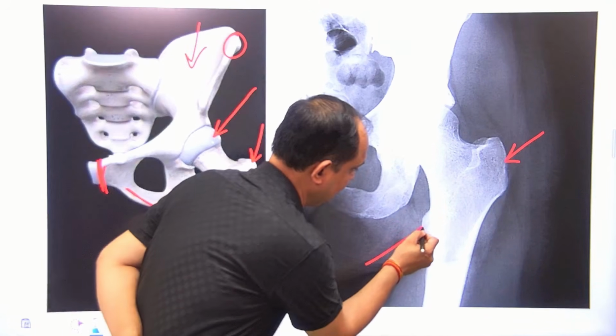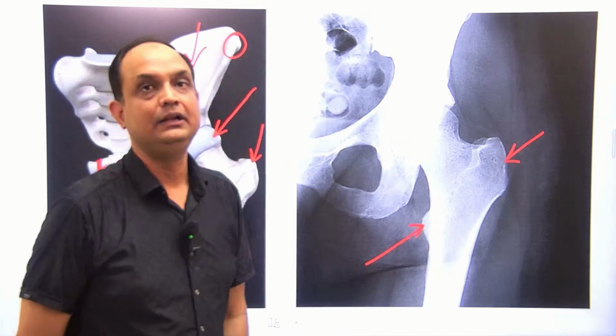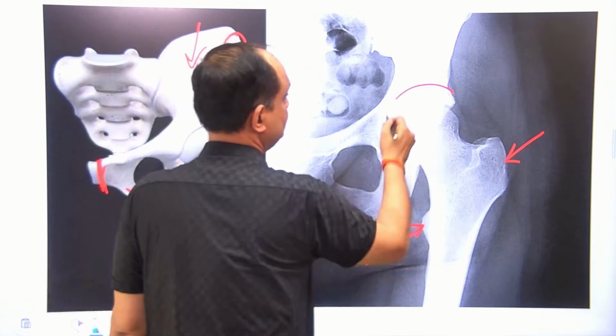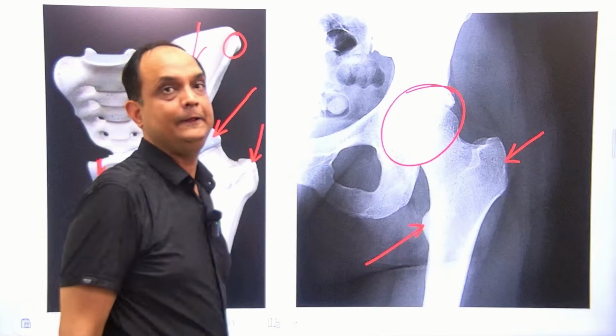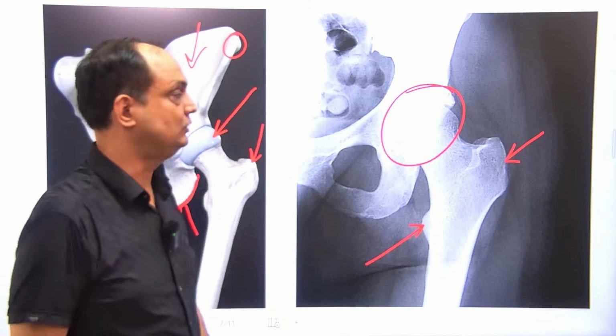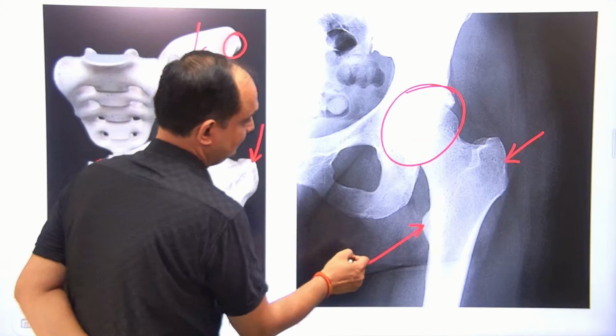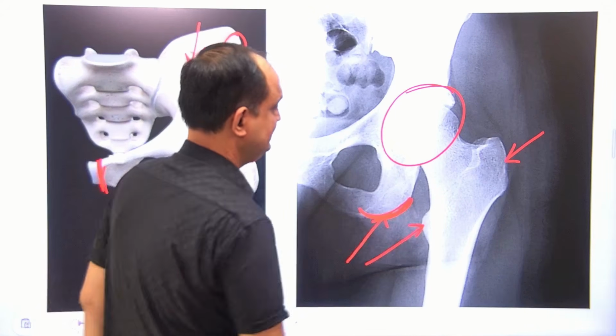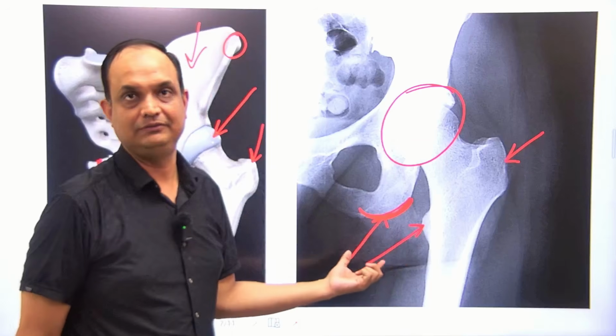Now what do I identify this? This is the lesser trochanter. Which muscle inserts here? Iliacus and psoas major. What type of joint is it? So it is again a hip joint, a synovial joint. What type of synovial? Ball and socket type. Now here you will have, what is this? So this is the ischial tuberosity. Which muscle arises here? So the answer is hamstring muscles arise here.